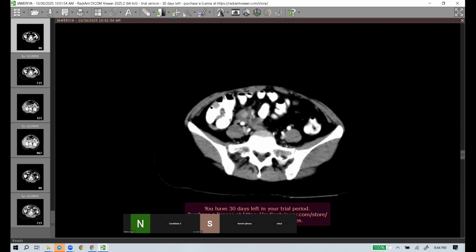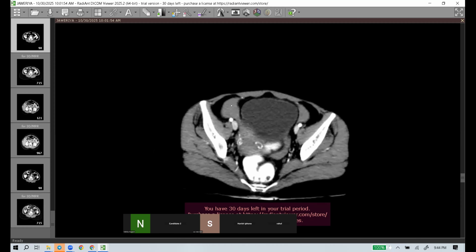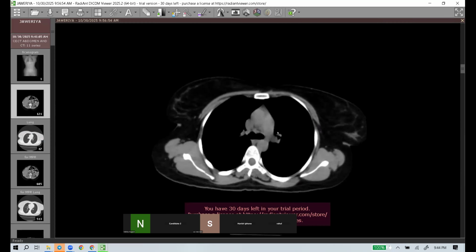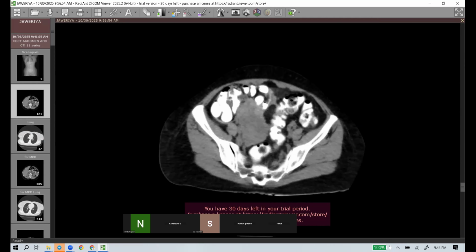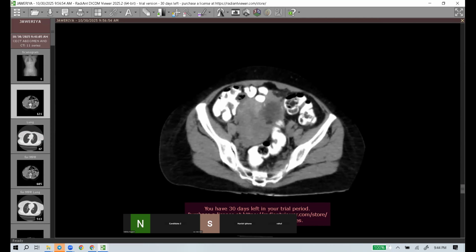All that was fine, and later you also found a lot of collection, and whenever in CT or in ultrasound, unless you see a very clear fluid density or completely anechoic, better not to use the word free fluid. You can just say isodense collection, hypodense collection. That would be better. So you can see this is a hyperdense collection. If you come back to the plain series, this was plain, this was hyperdense. There's no need, particularly if the examiner will show you, you will say that I will see in the non-enhanced phase plain images that this is a hyperdense collection.